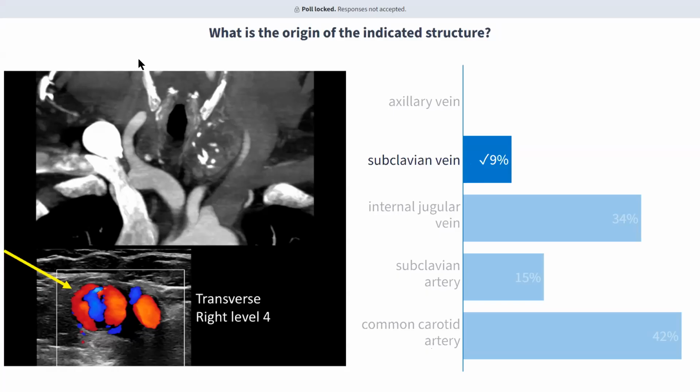The internal jugular vein is coursing along here, and it's not opacified with contrast because this is a CT angiogram, and you have to know that most of the contrast has reached the arteries but not drained into the veins yet. And this is from the tail end of the contrast injection, and this is so dense because it's refluxed up from the subclavian vein.